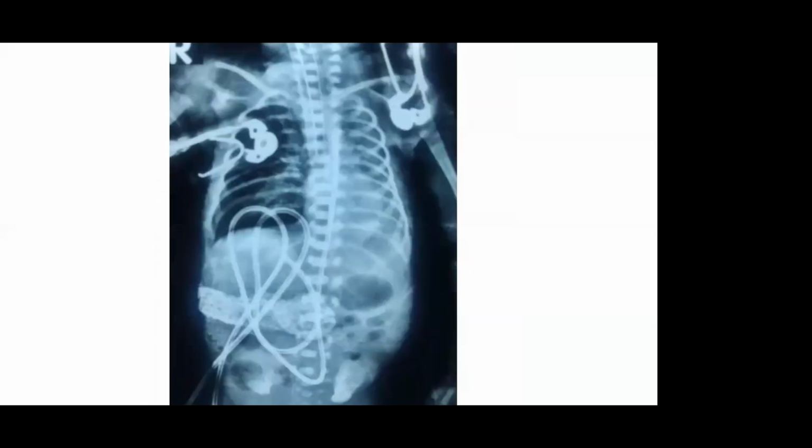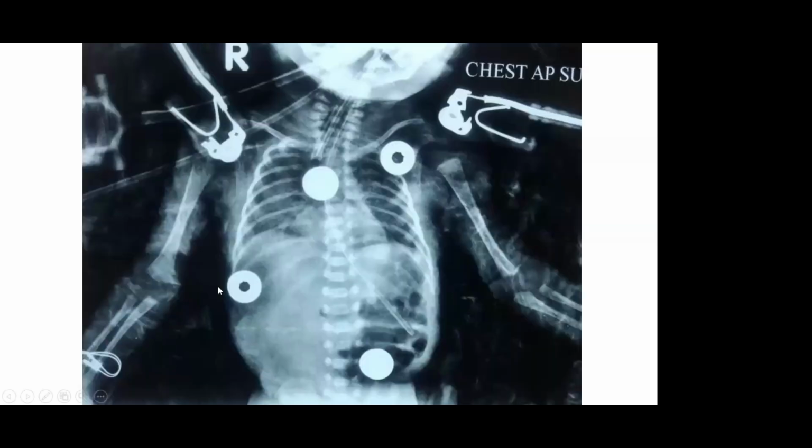Again, a rotation like this, lead placement like this, will create an unnecessary impression of right lung developing pneumothorax, left lung getting collapsed, and simultaneously you start creating misdiagnosis. You want to see the right lung field, but the ECG lead is obstructing everything. And here, see this, your catheter tip position, whatever you want to diagnose, those went haywire.